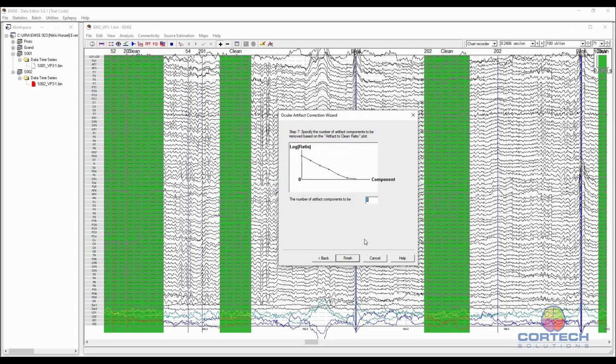Okay, now the scree plot for Lloyd looks different. Well, first of all, this is an effect of not having as many blinks to choose from. And we're not seeing the tail end of this one, but we might have up to 1, 2, 3, 4.